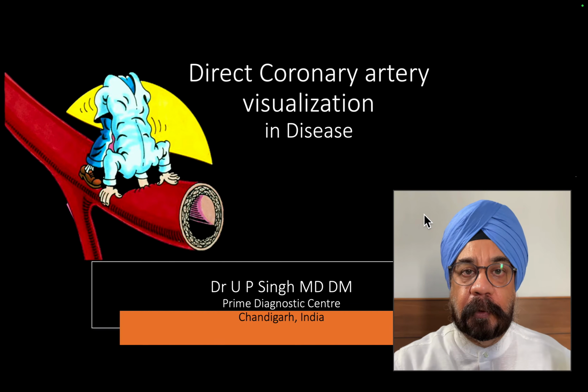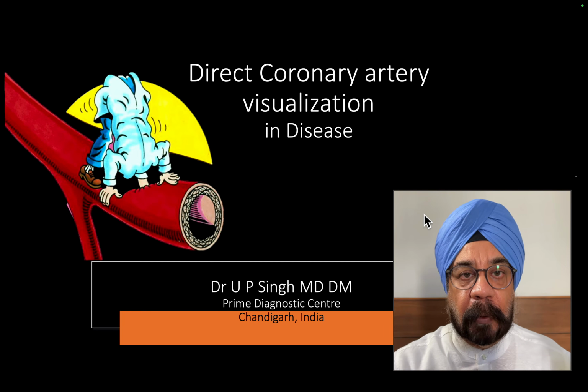Coronary artery visualization. I discussed how to visualize coronary arteries in the previous YouTube video. I told you how to optimize your equipment, where to look for the coronary arteries, and which segments of the coronary artery can be seen on echocardiography with ease, and you should focus on that, and also the clinical utility of visualizing the coronary arteries, in part 1 of this continued talk. So in part 2 I am going to show you the case reports which we have seen in the past.